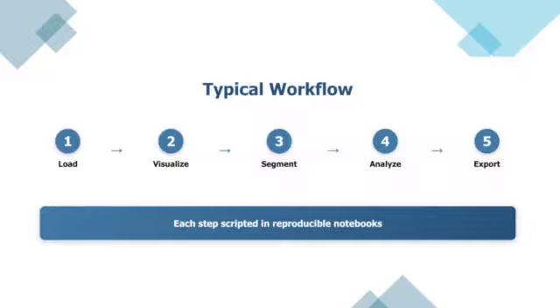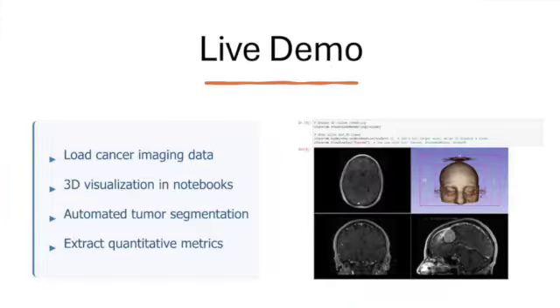So let's see this in action. For the live demo, I'm going to go to the CGC platform. I'm already logged in. What we're going to do is talk about loading cancer imaging data. We're going to create a 3D visualization. I'll show you how to use the notebooks. Then we'll run an automated tumor segmentation and extract some quantitative metrics.